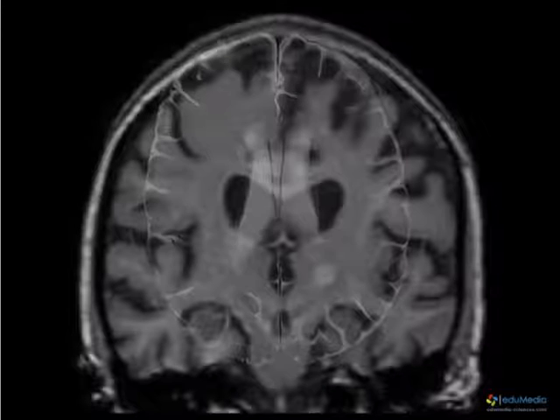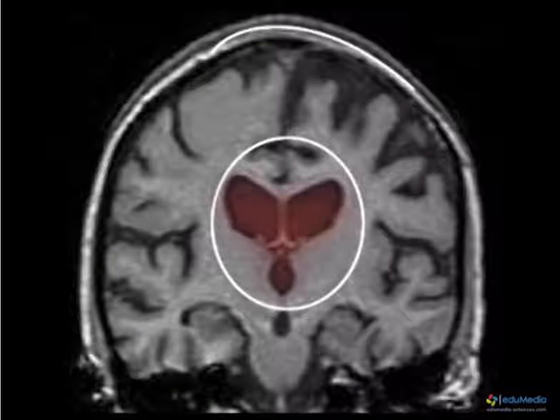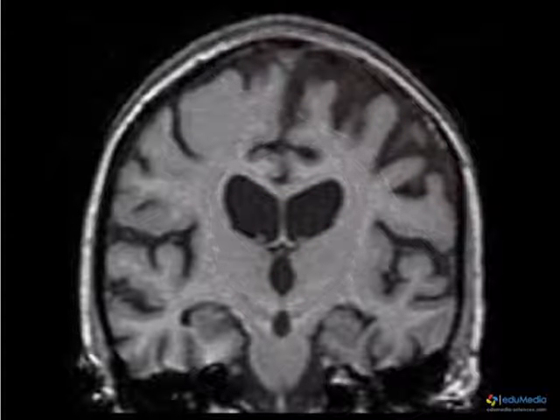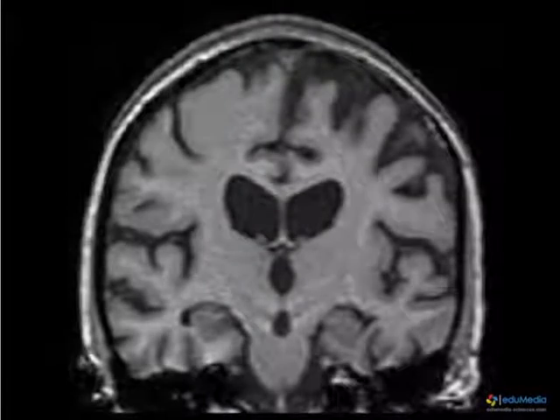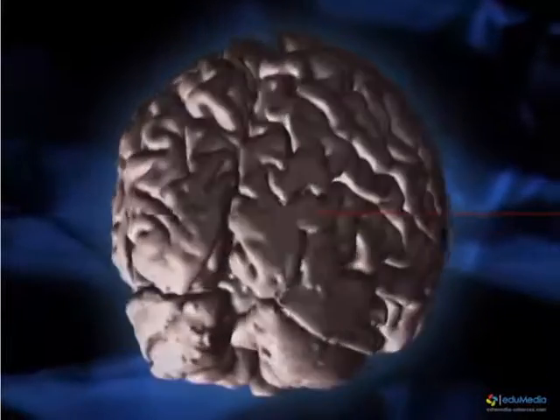This other photograph shows regions of degeneration that could be attributed to Alzheimer's disease. But in this case, the MRI serves above all to eliminate the possibility of other pathologies, like, for instance, a tumor. Functional MRI is an application of MRI to the brain.